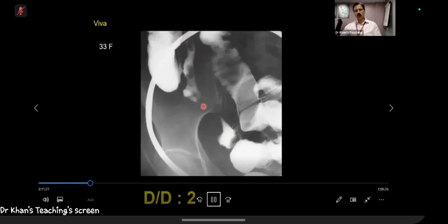This is the mesenteric border. This is the anti-mesenteric border. We call it pseudo-sacculations, which can happen, fibrosis, which happens on the anti-mesenteric border. You can see this stricture here. And then there is a skip lesion, and you can see these aphthoid ulcers.